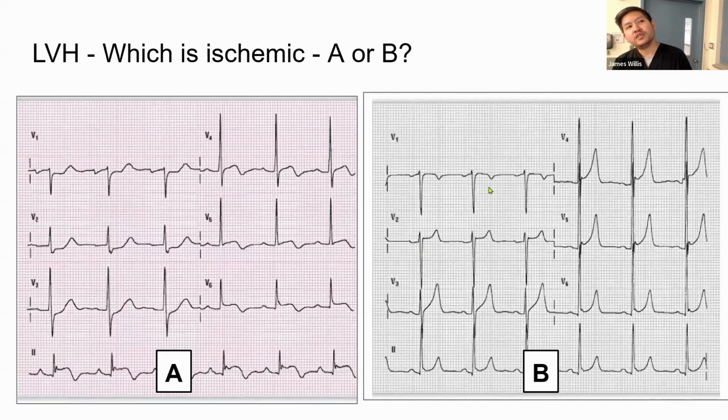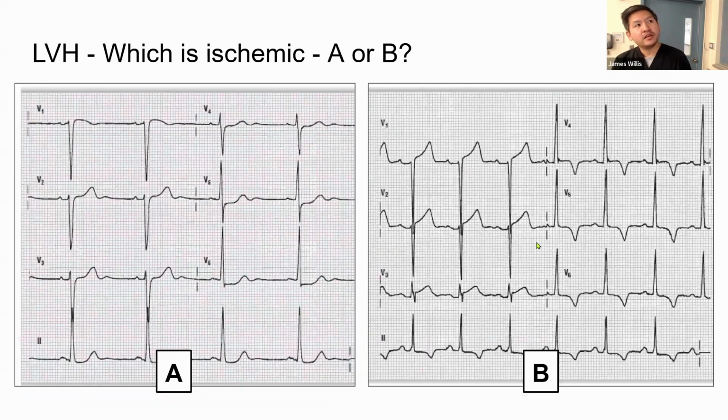Are you guys worried about this one here? Yeah, this one's actually LVH with early repol, also kind of giving you a headache, but we'll go over early repol next time. To me, this is a fine EKG. Not normal, but not enough to diagnose an MI. What about this one?